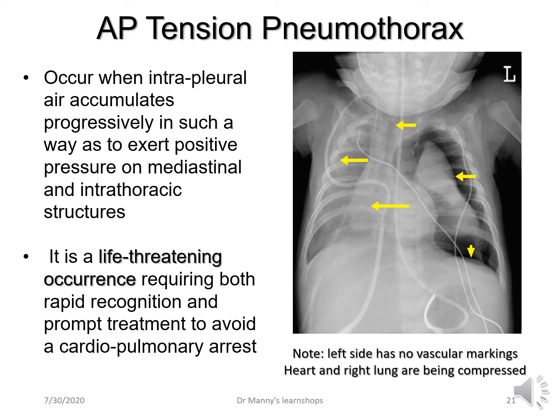Now, tension pneumothorax, as seen here on a paediatric patient, you can still see some of the lung inflated on the left side, but make the comparison. See the blackness, you've got increased blackness, left hemidiaphragm is being pushed down, you've got the left lung being compressed, you've got a degree of tracheal deviation, you've got some mediastinal shift and some compression of the right lung.